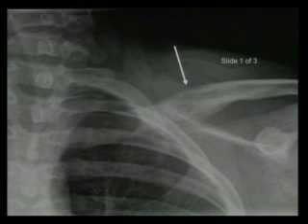So let's start with osteomyelitis. Here was a permeative lesion in the clavicle. You would worry, okay, could that be infectious? Could that be a Ewing sarcoma? Ewing sarcoma can affect flat bones. Ewing sarcoma usually affects cylindrical bones in younger children and flat bones in older children and young adults. But this could have been a Ewing sarcoma.